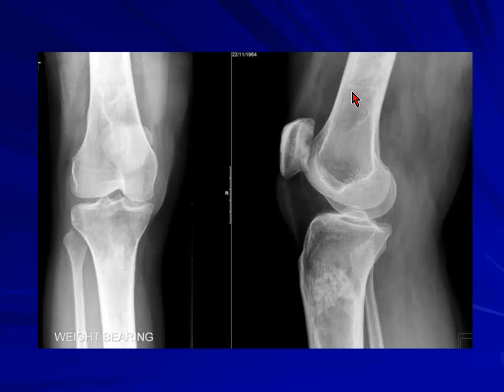Somebody was asking me yesterday about the uptake in the last scan. Basically, if you see this, you see these thread-like projections coming out, extending to the other cortex. So how you will define it: there is heterogeneity with areas of trabecular thickening, showing increased density.